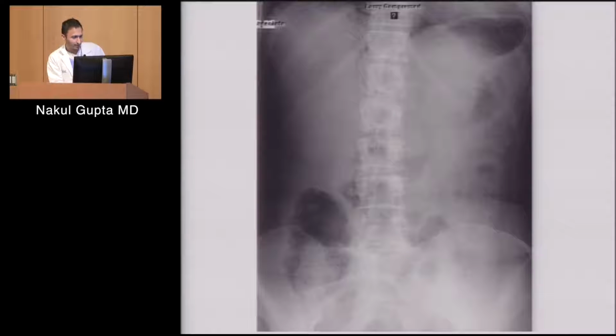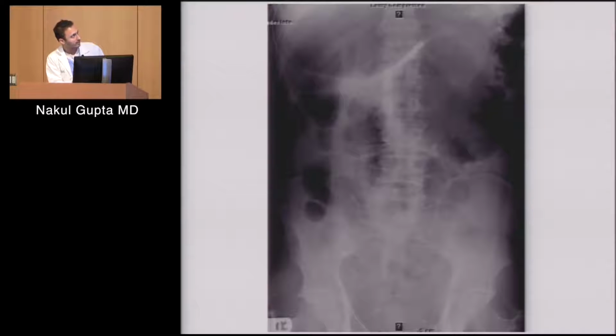It looks like he subsequently, well, let's come back to that. So this is a case of cecal volvulus. So cecal volvulus oftentimes, similar to sigmoid volvulus, we'll see this large distended segment of colon, except that it tends to flip more either into the upper abdomen in general or towards the left upper quadrant sometimes. So the cecum is typically in the right lower quadrant. Now when you have cecal volvulus, once it volvulizes, it tends to flip up into the upper abdomen, which is what's happened here. And then similar to sigmoid volvulus, the inflow and outflow are obstructed, and so you get a lot of gas building up, and it distends.